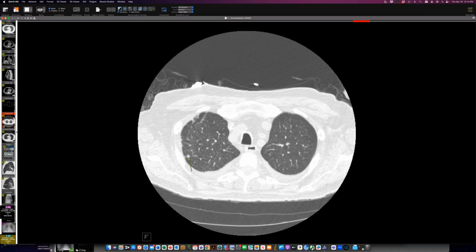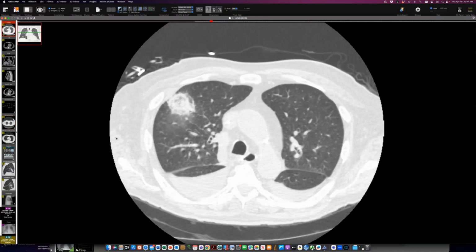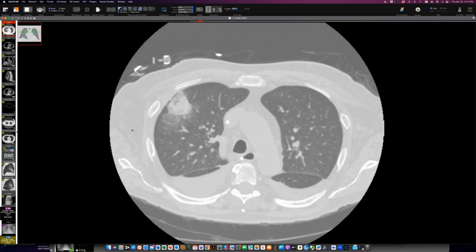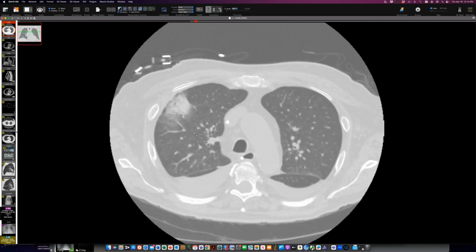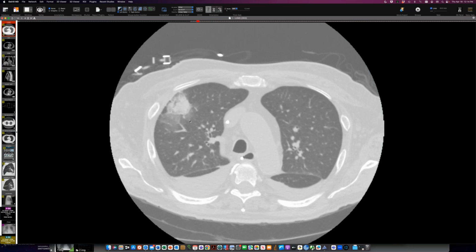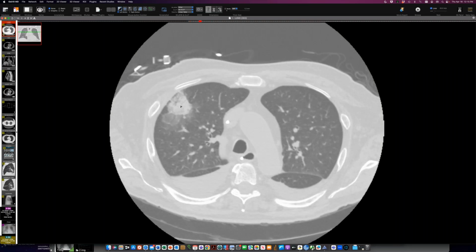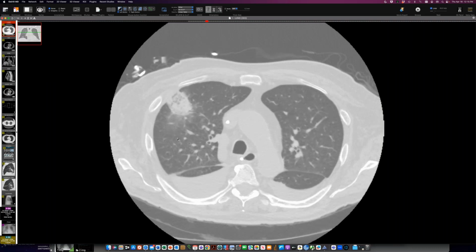indeed there is a nodular lesion with kind of a lacy interior, not a very well defined rind around it, but not a bad pattern for mucor. That bird's nest pattern is the dense periphery and then the kind of lacy interior. And this turns out to be mucor. Indeed, this is Rhizopus microsporus, which is one of the mucor species we see commonly.